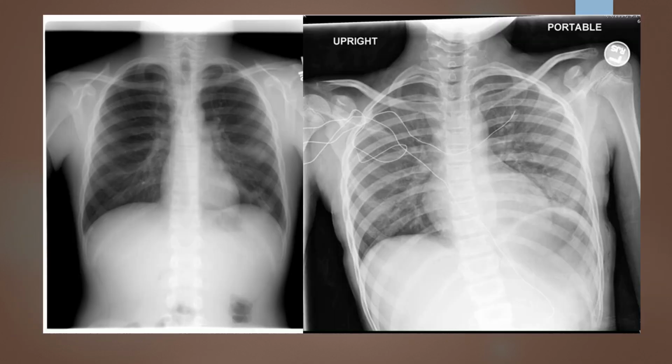I'm going to have you take a quick look at these couple of images and practice your evaluation, working your way through these, and see if you find that you're feeling more and more comfortable as we go.